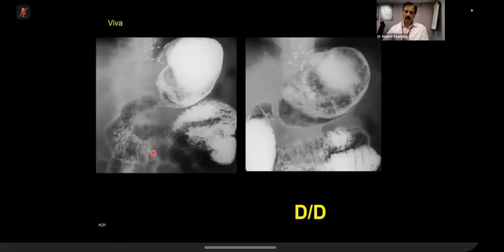Now, this is very well done, and you can mute yourself now. Thank you. Next will be candidate 6. Be ready. Let me tell you about this film. Now, on this film, there is something here which has got this mottled type of appearance. With that, there is antrectomy. So this is again Billroth 1.